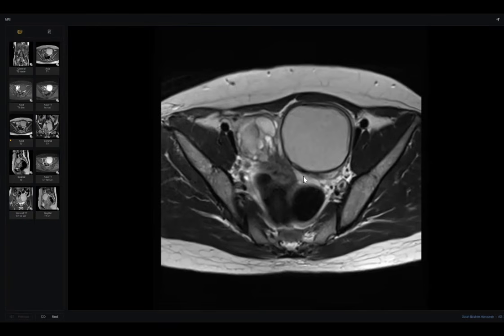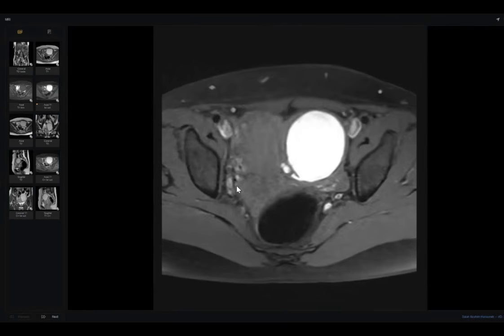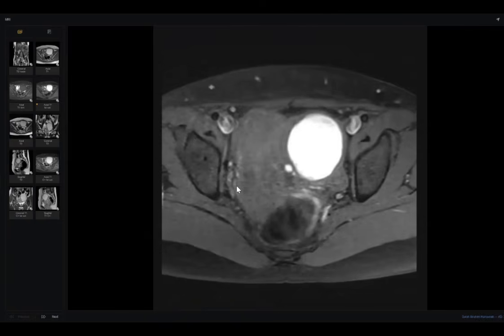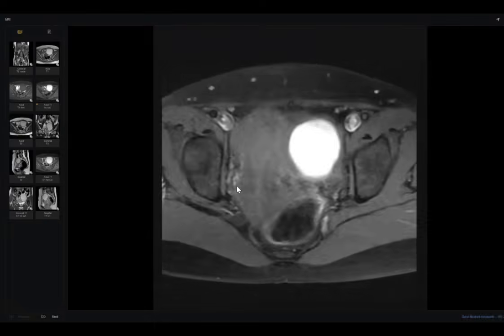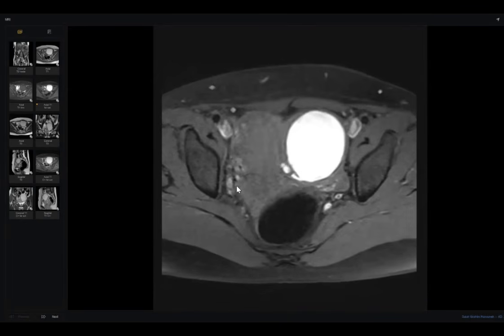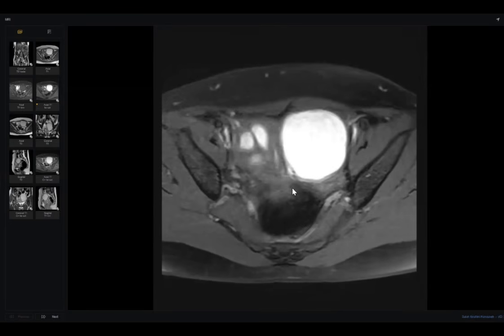Great. What's your final diagnosis? So my final diagnosis is deep pelvic endometriosis with endometriotic deposits in the cul-de-sac. Which structure do you want to rule out if it is affected with endometriosis? It can be bladder, broad ligaments, bowel, and anterior abdominal wall. Once the clover sign is seen, the bowel is already affected.